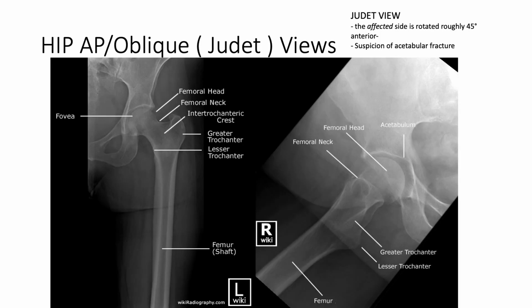As to the hip joint, an AP view is mostly enough already to see your anatomy. But sometimes we see suspicious fractures of the neck or the acetabular rim, that we may want to see another view.